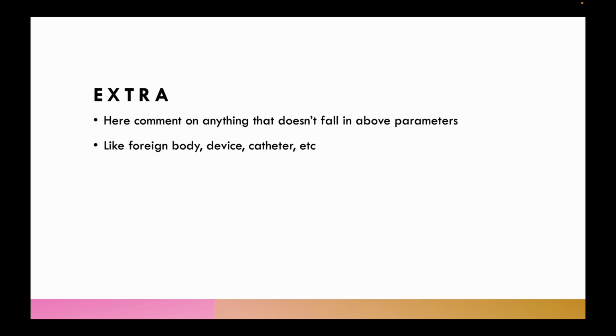Then last E. E means extra. Here you have to comment anything that has not been described in previous steps and which is visible in the radiograph, which could be foreign body or any device, catheter, etc.